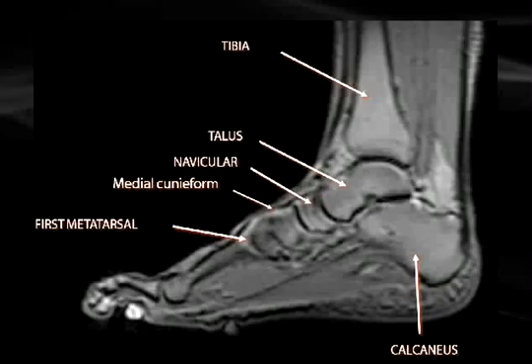In this MRI of the foot, you can see again, this is clearly an MRI. The bones are not radiodense. They have a grayscale factor to them. And you can see the soft tissues of the foot. What you might look for in this type of image is, again, the joint spaces, some of the muscular compartments. Look for fluid accumulations in some of those compartments. Look for a fiber direction, and if there's any deviation of the fiber direction, which can be an indication of fluid accumulation that's hydrodissecting between compartments and putting pressure on things.